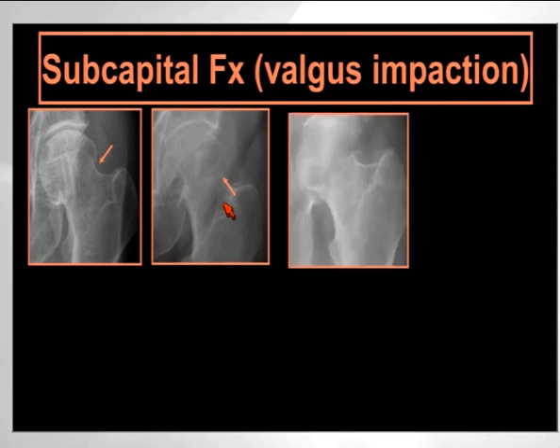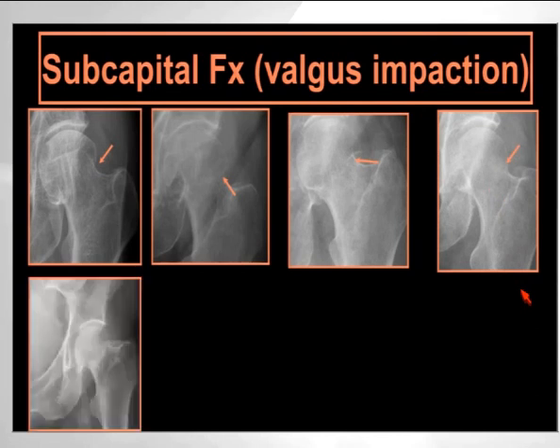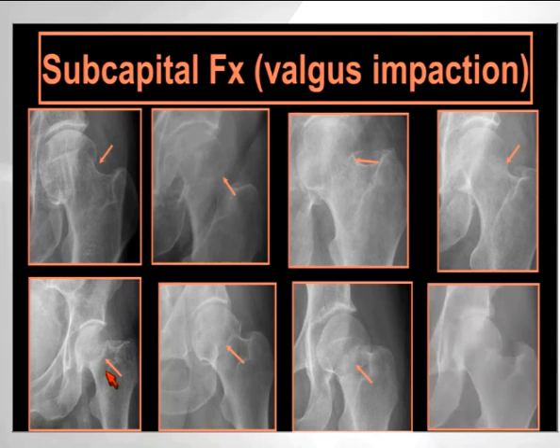Here is another fracture. Look at the beak, and this is the sclerosis we are seeing, but there is disruption. Another one, this is very subtle, just ill-defined sclerosis. Again, you have to follow your trabecula to see the distortion. So these are more obvious fractures with more impaction. So this is significant impaction. Another one with less impaction, slightly more distraction. This is more distraction. And here's another one. Actually, this is a complete fracture because it's involving the medial cortex.